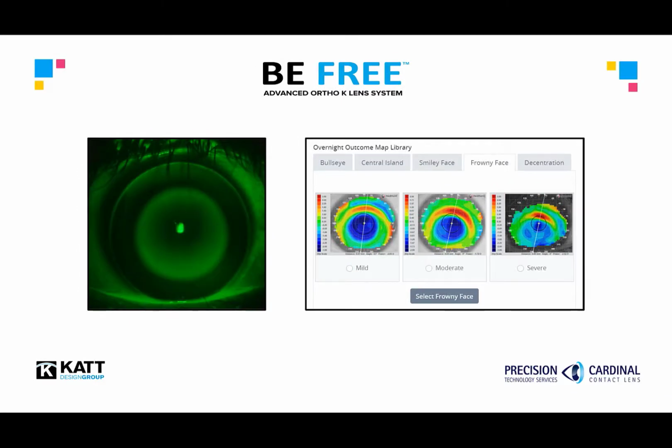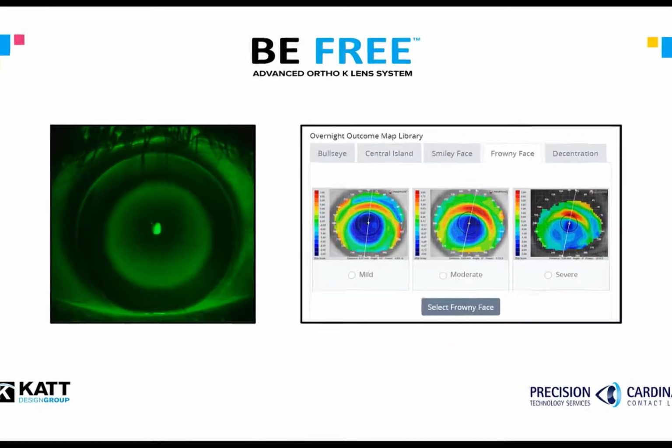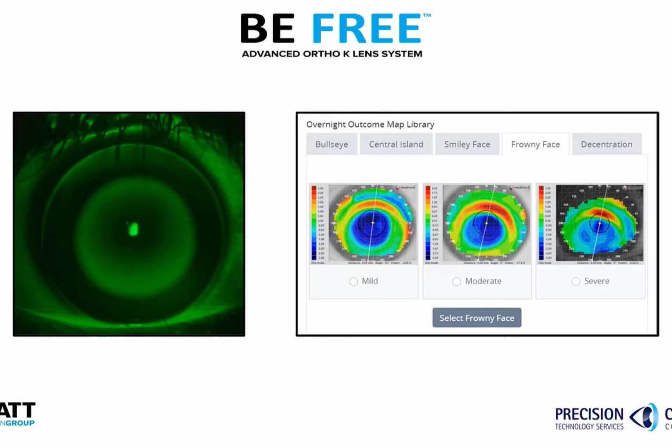Conversely, lens discomfort can be due to inadequate edge lift or a lens appearing low and tight in the periphery. This is resolved with the frowny face response. Again, choose mild, moderate, or severe based on the degree of change required. The frowny face response can also be used in cases of adherence or when a lens is hard to remove.